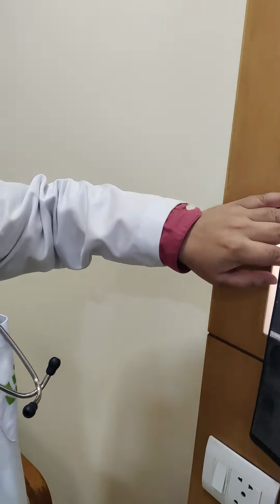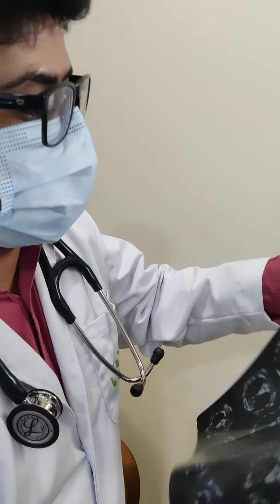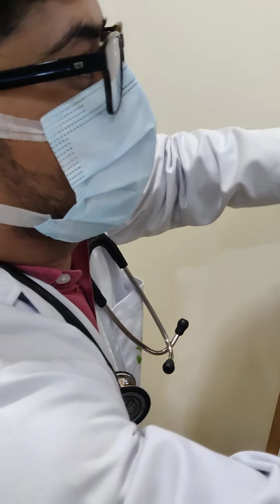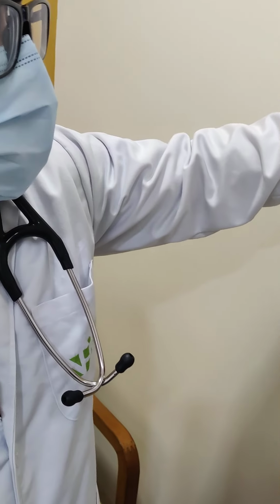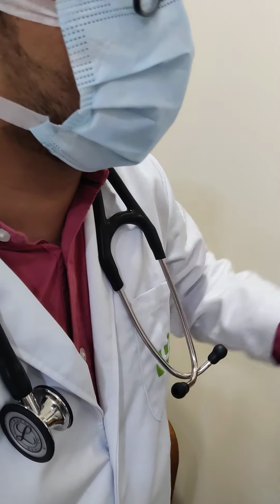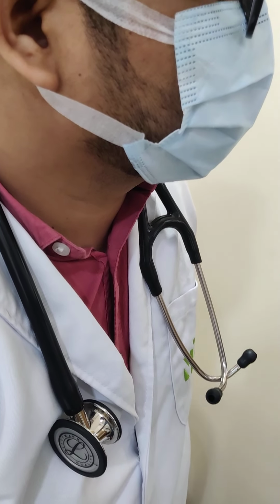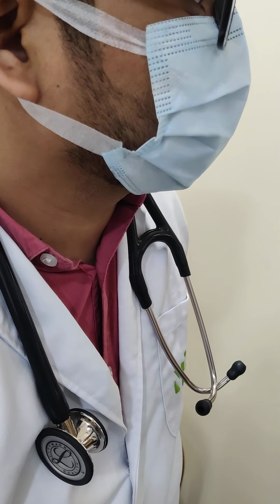Now the second thing is that if you see the CT, no, not here, put the mediastinal window. In the mediastinal window, what we are seeing is that, very interesting, there is bilateral pleural effusion, you see, there are pleural changes. You see, there are pleural changes, the calcified aorta also we have there, maybe old changes.